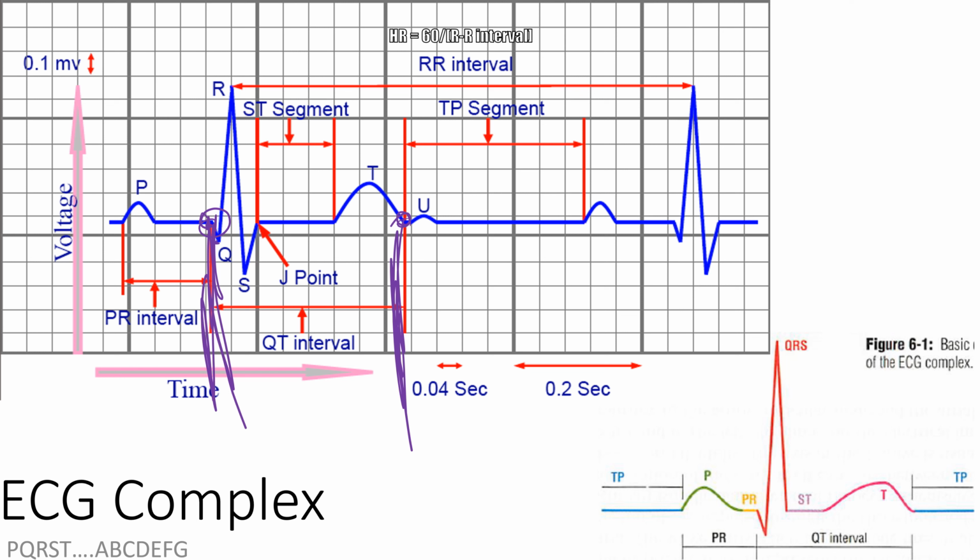And we have the PR interval, which is what? Isoelectric, not the top of the P wave, not the beginning, not the end of the P wave, but before the P wave even lifts off, right? So isoelectric to isoelectric. So we're measuring PR interval. That is an important interval that will let us know if we have a bundle branch or an AV block.